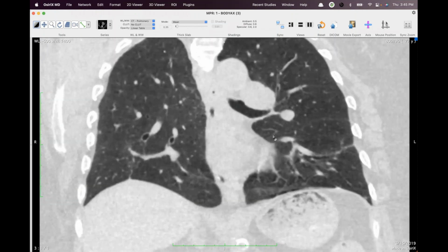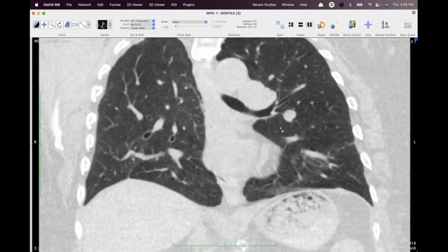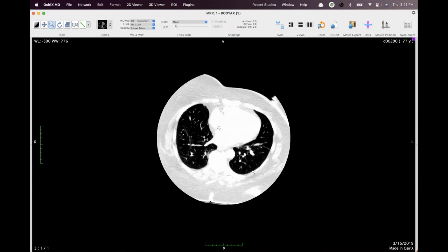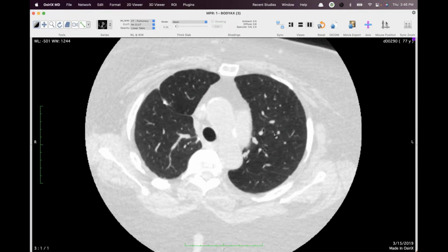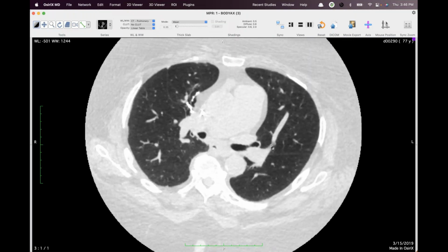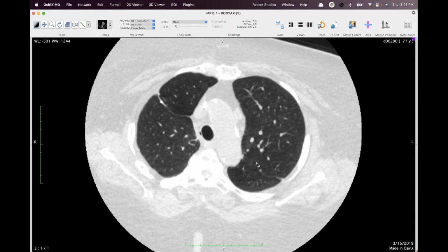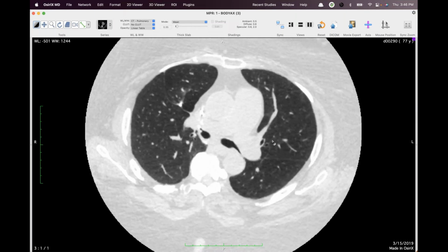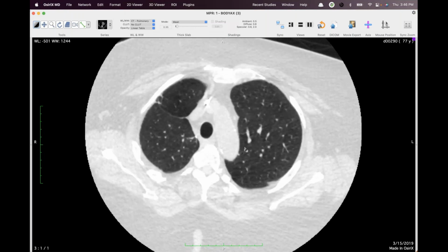At first, in your first imaging, I thought there was a pleural line, but I think that was actually just skimming a vessel rather than a pleural envelope. So I think the rest of the anatomy in that left upper lobe is just a displaced segmental bronchus, whether it's apical or posterior, probably more likely posterior. And then there's an anterior and apical right here, and then that's just going to this portion.